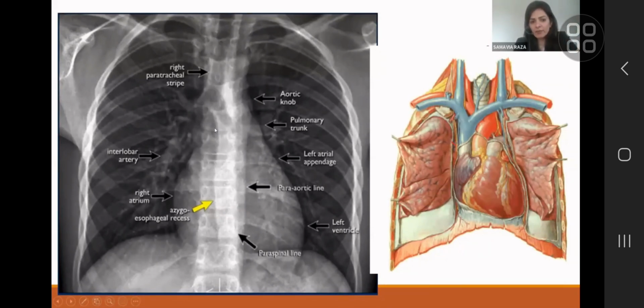You don't always see it as clearly as this in a normal patient, but if you see it higher density, or if you see something white here and you think, oh, I can't see the line, is it important? Then what you do is you compare, and that's the best part about chest and organs that have two parts. You can compare the two sides. If it's fuzzy or white on one side, it will be fuzzy and white on the other. So if somebody is big and they have a lot of mediastinal fat, it will get fuzzy on both sides. So there is no absolute value of which vertebral level the SVC and azygos will join. I hope that answers the question.